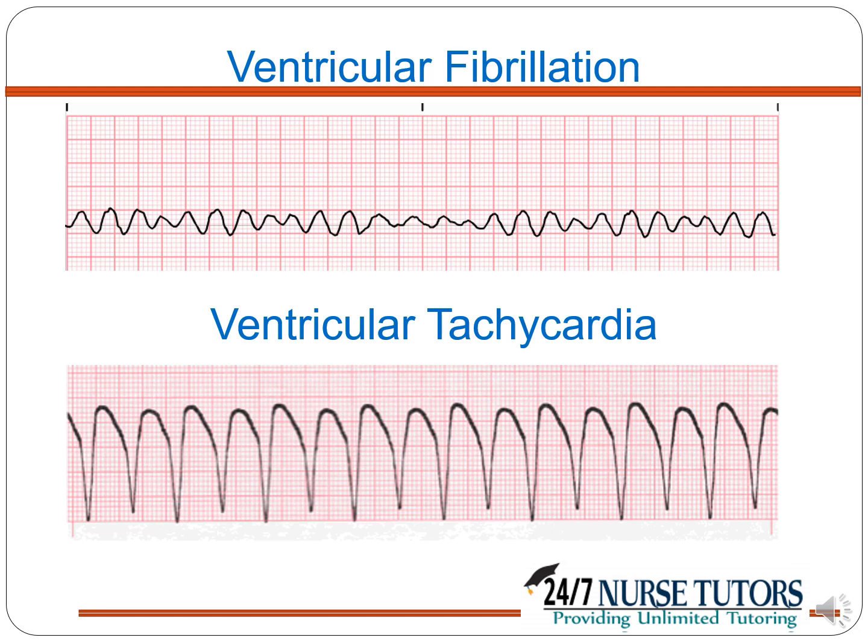Again, check your patient. Ventricular fibrillation is a life-threatening cardiac arrhythmia in which the coordinated contraction of the ventricular myocardium is disorganized. VF usually ends in death within minutes unless prompt action is taken. The rate of survival in out-of-hospital cardiac arrest has increased with expansion of community-based emergency rescue systems and the use of automatic external defibrillators. In the hospital setting, current ACLS guidelines should be followed. Again, check your patient.